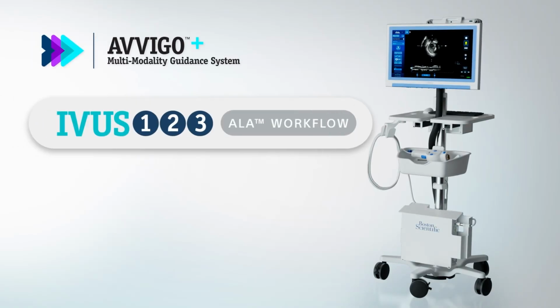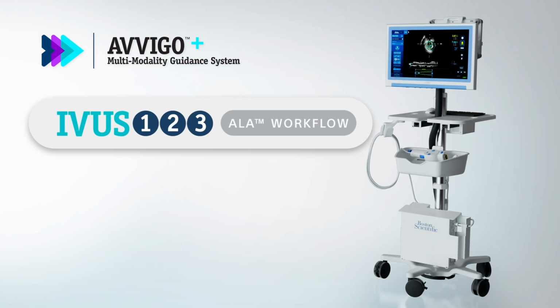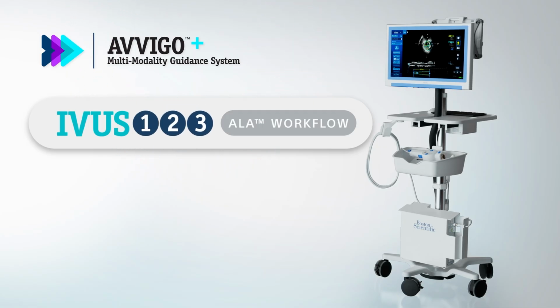This guide outlines the Automated Lesion Assessment, or ALA, workflows for pre-PCI and post-stent procedures utilizing IVUS 1, 2, 3.